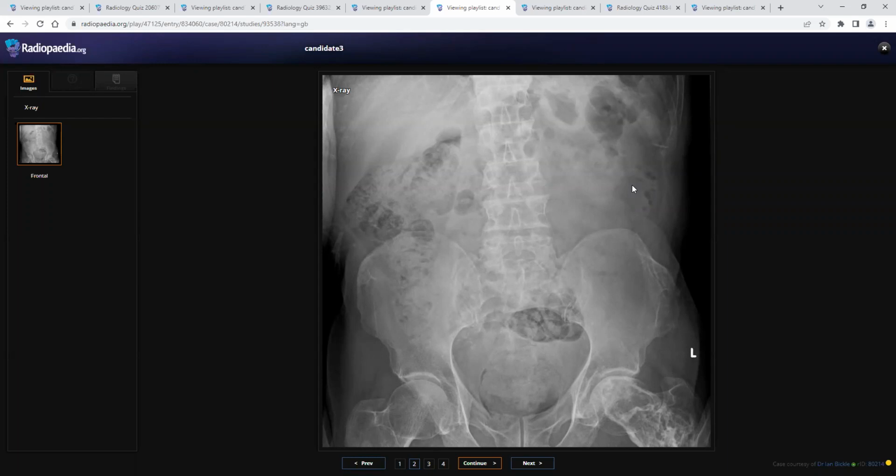But there was no history of trauma. So it appears to be pathological because there is underlying bone deformity, like the mixed lytic sclerotic lesion. I would like to have an X-ray of the left femur as well, and there is also irregularity along the left iliac blade.